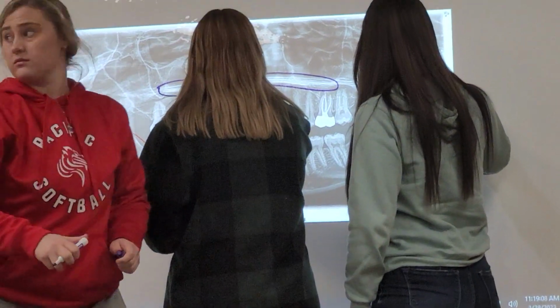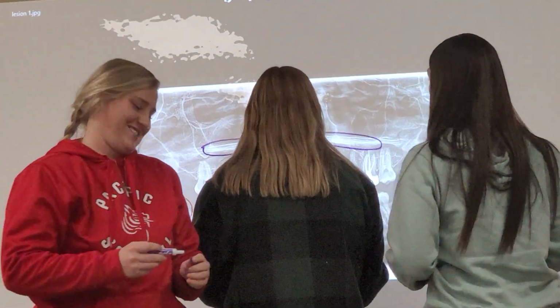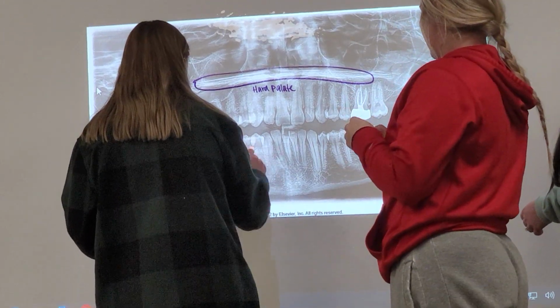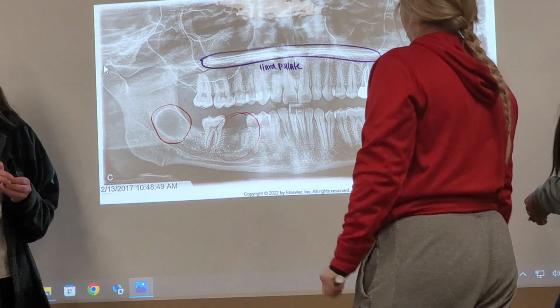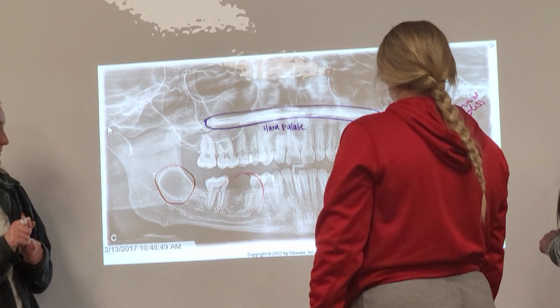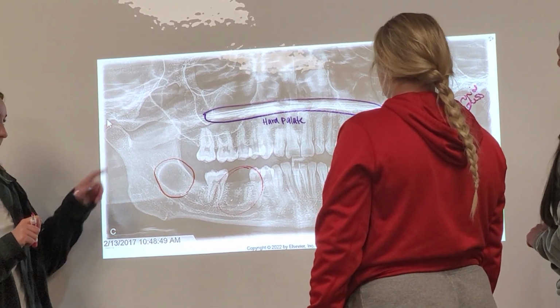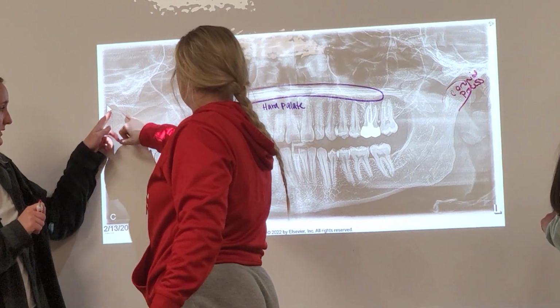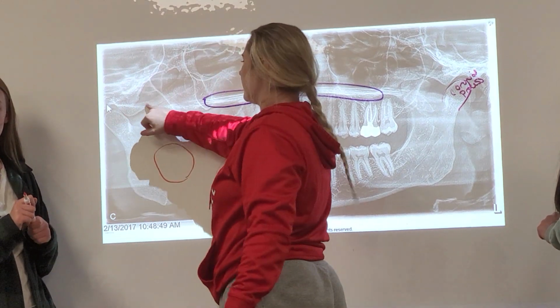Oh, wait. No, this isn't easy. I gave you a freebie. Okay, Michaela, where is the articular eminence? Oh, we're doing the pano? Okay. What's that? Oh. Here, the articular eminence right here. Yeah. And then the corner.